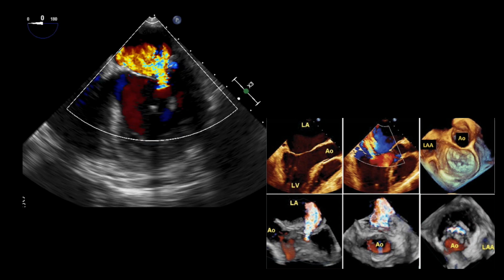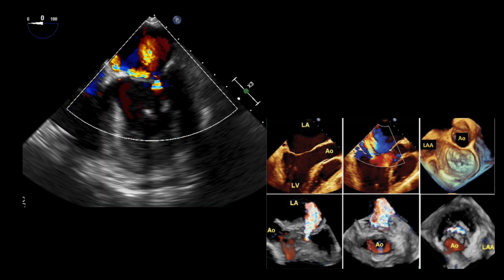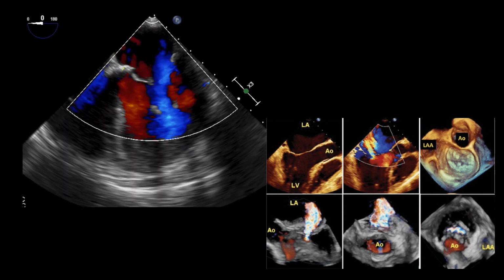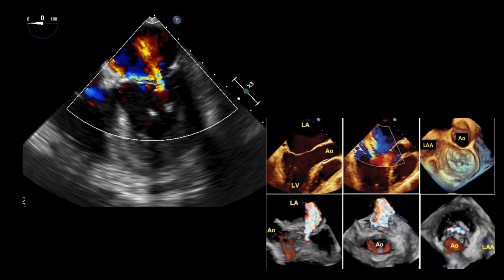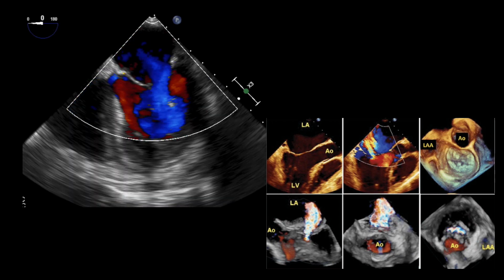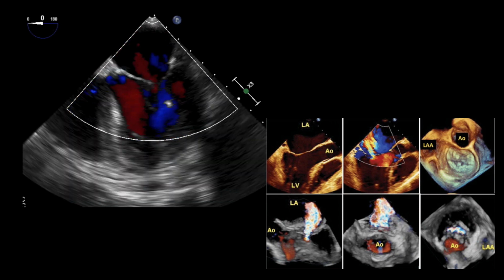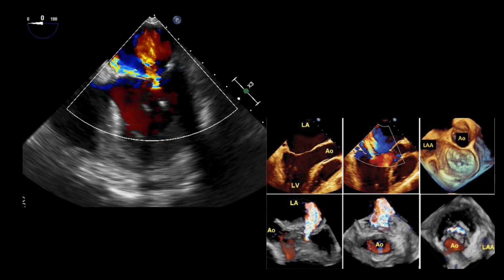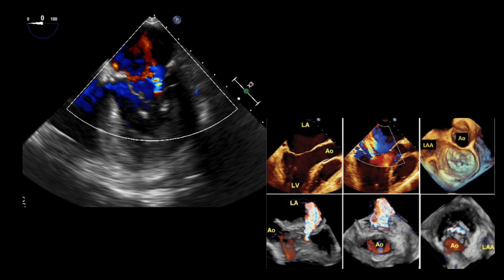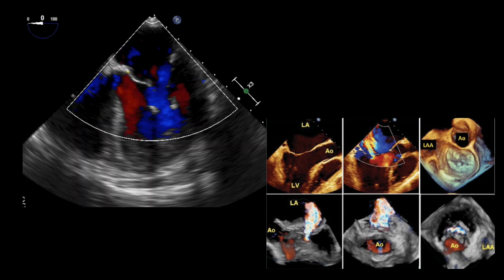Transesophageal echocardiography is especially useful when the quality of transthoracic echocardiography is not optimal, since it allows a detailed evaluation of the morphology of the mitral valve and the subvalvular apparatus. In 2D, the diameter of the mitral annulus can be quantified, as can the height and increase of the tenting area, as well as the traction and the decrease of the apposition surface.